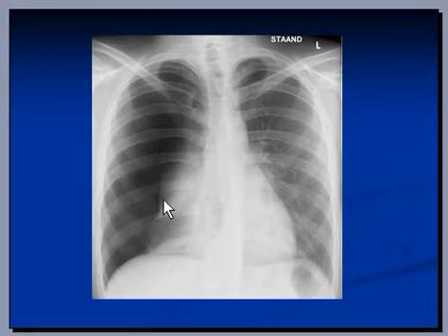Now this is the collapsed lung here, the right collapsed lung. So only one lung is functional at this point in time for this patient. The right lung is collapsed, and the only way to treat this condition is to try and insert a tube into the pleural cavity and try and pull that air out and try to expand that lung again.